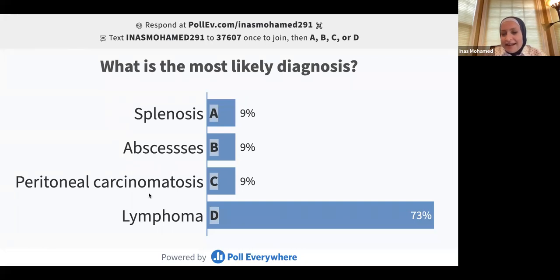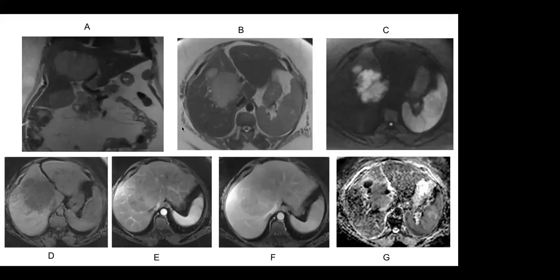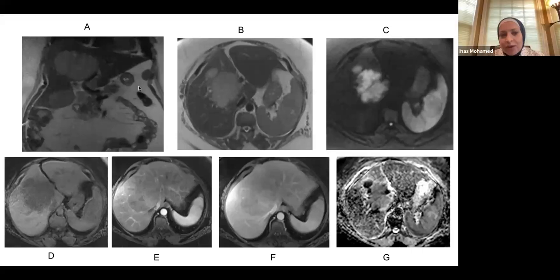Okay. Actually, this is very good. This is actually lymphoma. It turned out to be lymphoma. We had given them quite a differential because she was a patient who presented with fever and stuff. We put lymphoma in the differential, but it wasn't at the top of our differentials. The subtle finding is that there's something happening in the spleen here. So you have both splenic and hepatic involvement.